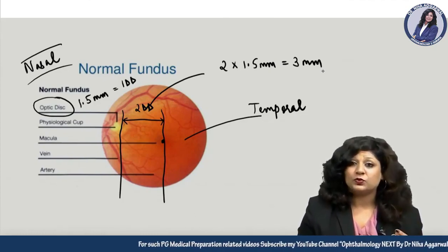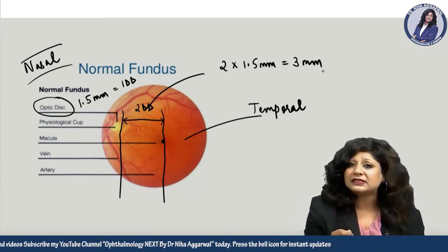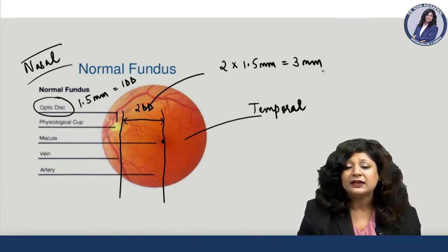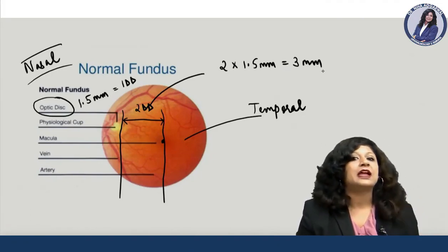I know that you can identify a macula just by seeing it also, but this is especially important for the pathologies where the actual structure of the macula may be hidden or the reflex may not be seen. Now what reflex am I actually talking about?